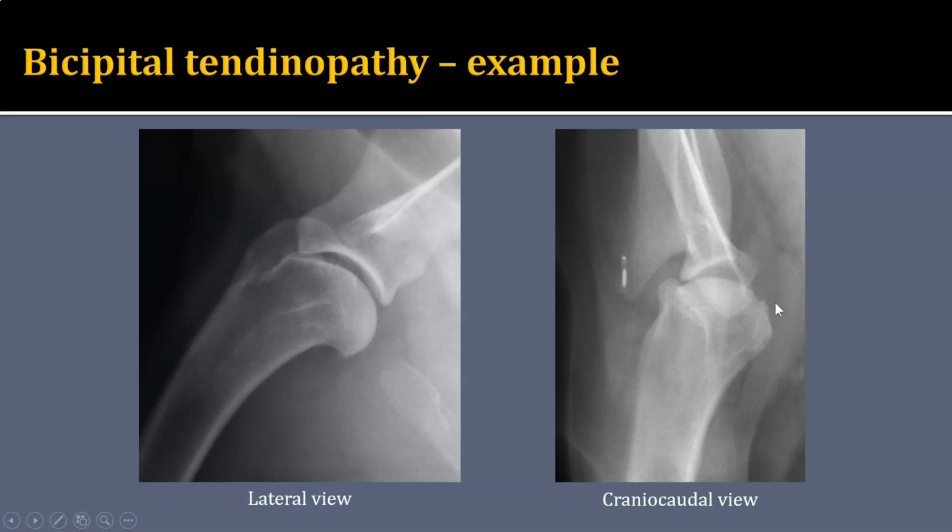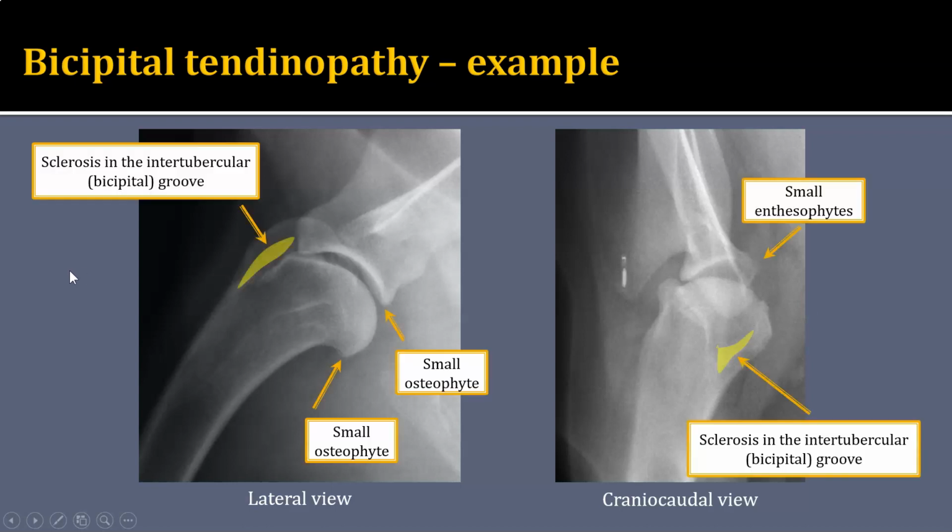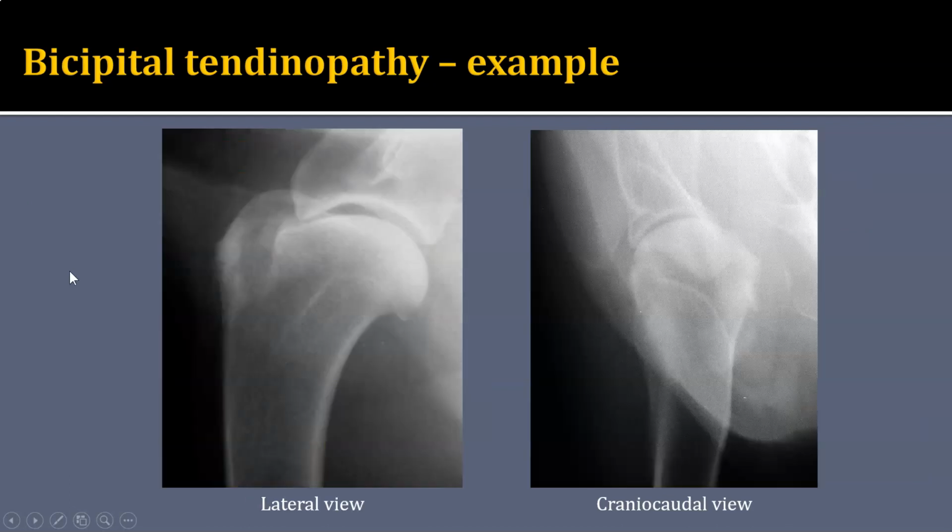However, this patient probably does have some medial instability, which can be part of rotator cuff injury that can happen in our dogs. Sometimes you'll also see a little bit of irregularity out here, enthesopathy or osteophytes, if there is damage to that medial compartment. This is just a labeled slide for your use for studying.